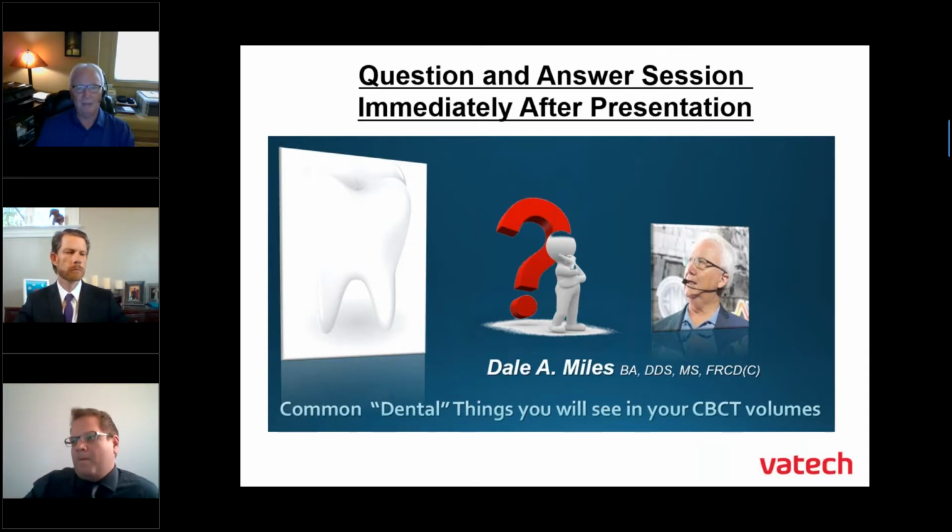Those are the three stages, and you have to understand all of them. Clinically, do the vitality testing and percussion sensitivity, and make sure there's no disease before calling it periapical cemental dysplasia. But PCD is quite common.